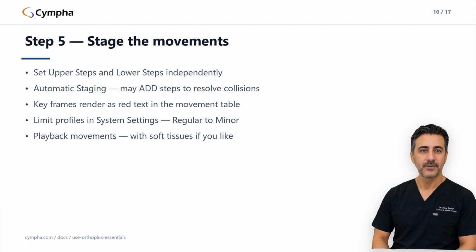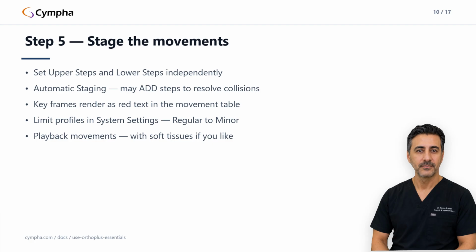Movement limits are governed by name profiles in the System Settings dialog. Regular, substantial translations, substantial rotations, substantial translations and rotations, and minor movements, with per step and total limits underneath. Pick the profile that matches the case. Edit individual limits only when you know why.